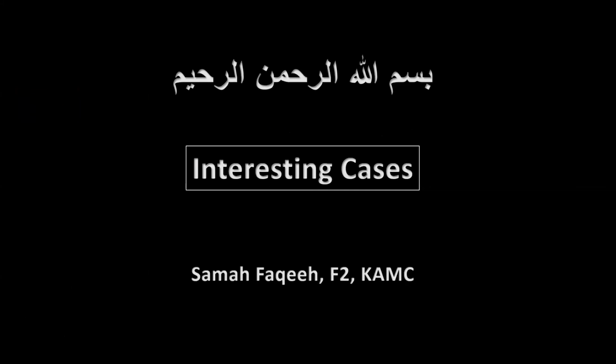We will use the polling, as we said before, as with Dr. Hannah's lecture. I will show the cases and I will ask you what's the most likely diagnosis, and I will provide some follow-up questions about the cases. I will do the polling. I'll give you 15 seconds to answer, and then I will share the results with you. And I will discuss the diagnosis and differential diagnosis of each case.